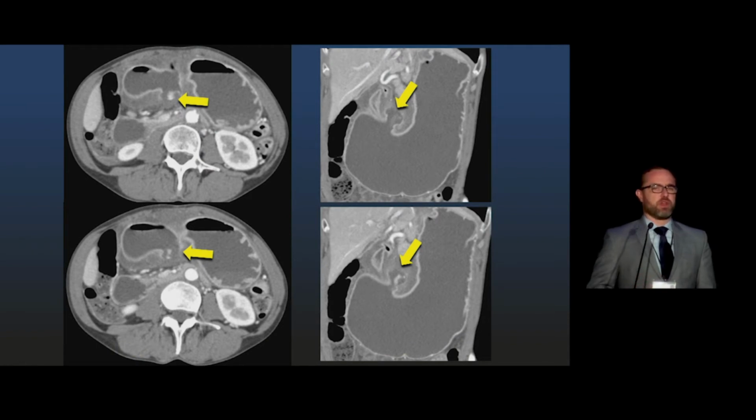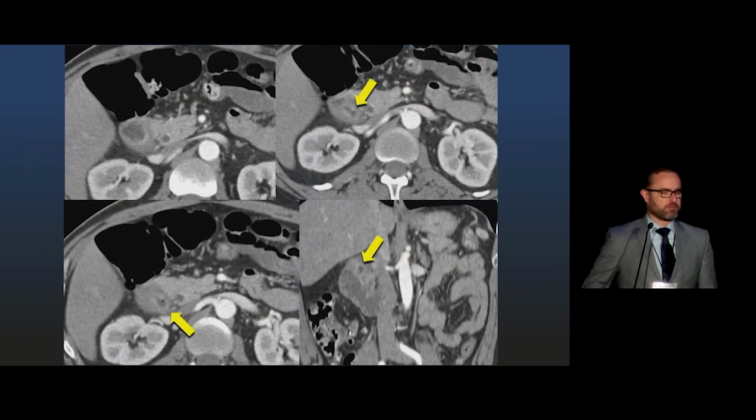This patient, on the other hand, we're perhaps more accustomed to seeing on CT. This is a patient with epigastric pain, a very distended stomach, and a focal outpouching from the lesser curvature with disruption of the normal mucosal enhancement, submucosal edema, and actually active bleeding due to their peptic ulcer disease. And so remember that peptic ulcers can be visible even before they perforate, and we should be looking for them in the lesser curvature of the stomach in particular.